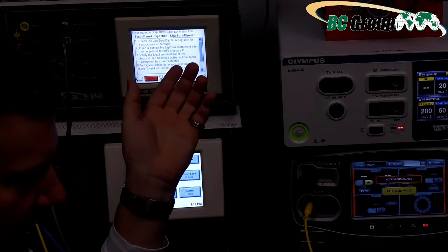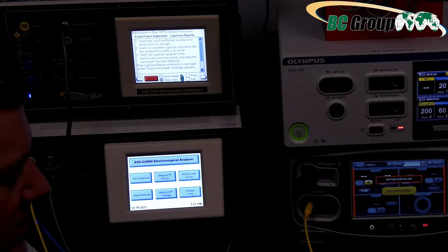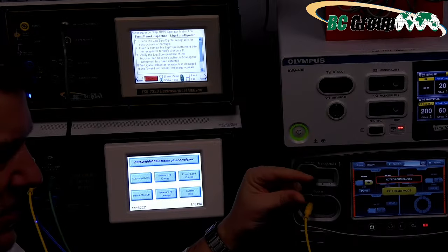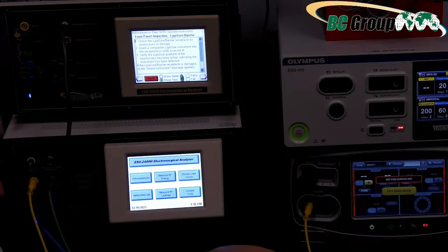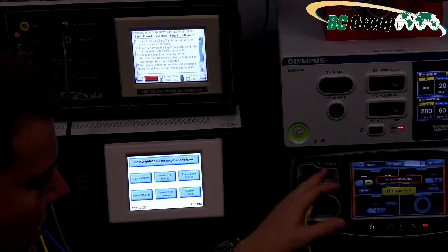And monopolar is when you have an electrode underneath the patient. It shoots electricity through the patient from one point to the next, and you need this. Bipolar, it's normally an instrument. Both sides of the instrument plug in right here. It's like tweezers, and they'll do techniques like dragging the tweezer past whatever tissue they want to damage, and the electricity jumps from point to point, and anything in between gets damaged, cauterized, etc.